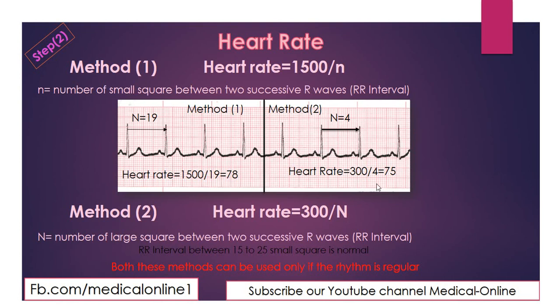N is the number of large squares between two successive R waves. So here it is capital N, and it represents the number of large squares. Just look at this one: 1, 2, 3 and 4, almost 4 large squares, so 300 divided by N is equal to 75, almost the same. So heart rate can be calculated very easily.